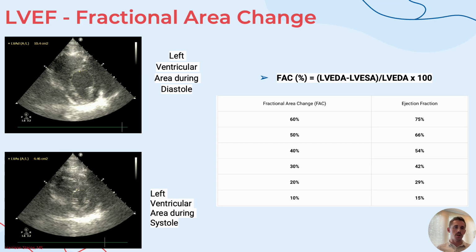And then we're inserting these values into the equation, which is over here on the right, to obtain the fractional change. So I think this one's a bit harder, just because as opposed to having a defined image of where that interventricular septum and the ventricular wall are stopping, you are needing to look at a parasternal short axis view and not fully aware of how high or how low you should be going in terms of diameter. That's at least my take. Obviously, someone who's much more experienced with ultrasound could probably find it in both.